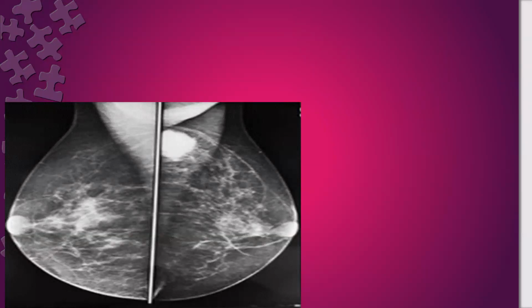Yeah, at the center of the breast. What do you mean by the center? Here? You are talking about this? You mean the right side? The pathology is on the left, Sarah.